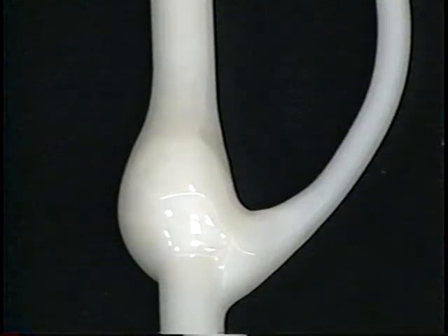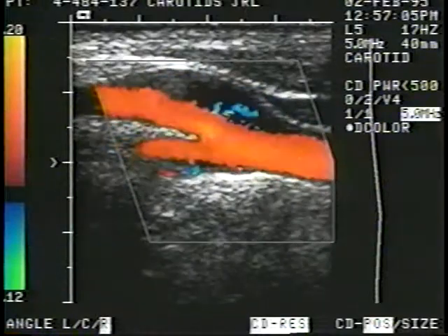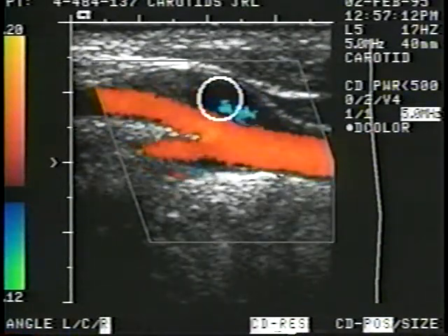Module 3 demonstrates a carotid bulb. The flow rate should be adjusted to fast. In this segment, one can observe the turbulence that occurs when fluid traveling in a laminar profile enters a larger chamber. A separation of the boundary layer from the vessel wall occurs with a small amount of fluid flowing in a retrograde manner toward the region of lower pressure. This colored Doppler segment shows flow separation occurring at the origin of the normal internal carotid artery and in the area of the carotid bulb.